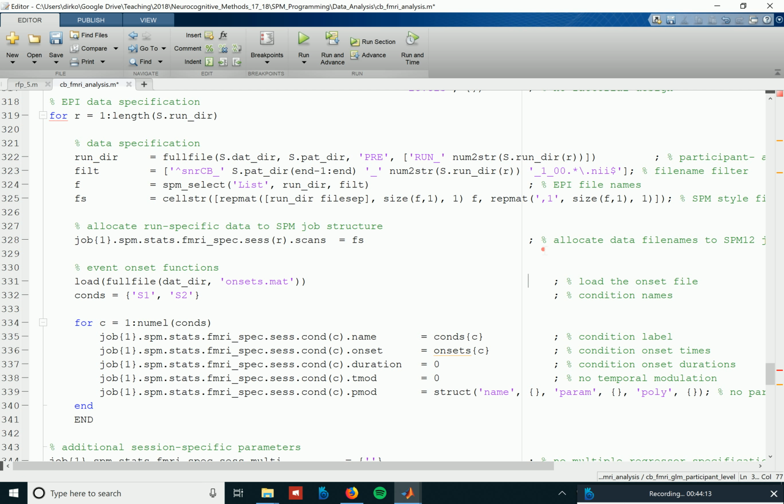Now we need to load, so this is where we went up to, so this is what we had done already. Now we need to load the onset event file, which ideally would be there in BIDS, but right now it's in kind of a semi-BIDS thing. It is in the run directory, because I just put it there, and it's called onsets run something.